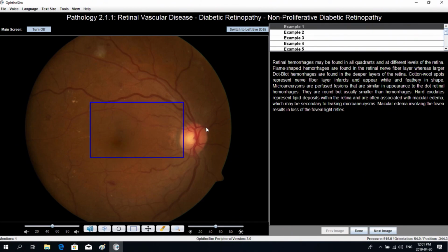of non-proliferative diabetic retinopathy. And the user would be free to look and inspect all the different areas by moving the scope around. There's no targeting mechanism associated with this particular functionality. It's just a quick look for the user.